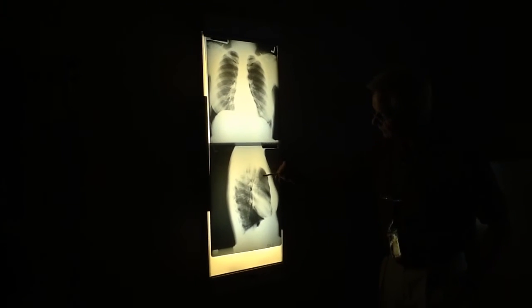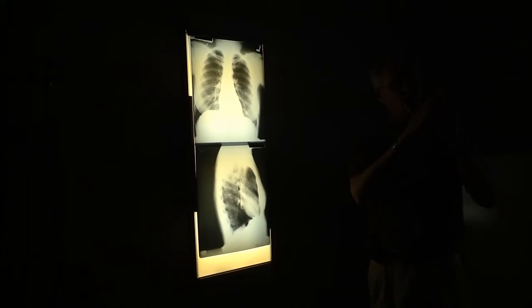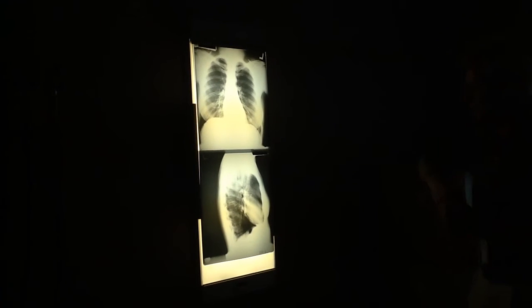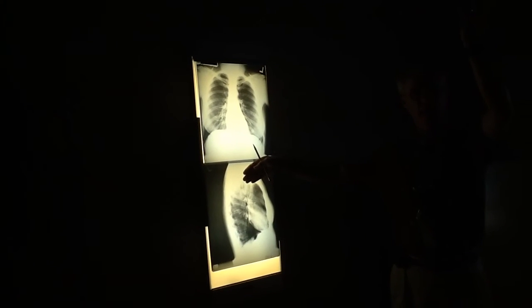So this has to be a mediastinal mass because there's nothing in the lungs that would account for that density. So it's got to be in the center. It just didn't go far enough laterally to change the configuration of the mediastinum. So it's not down on the bottom, so we wouldn't consider Morgagni hernia or pericardial cyst because they're down here. Thyroid's up here. You know, thyroid's up high.